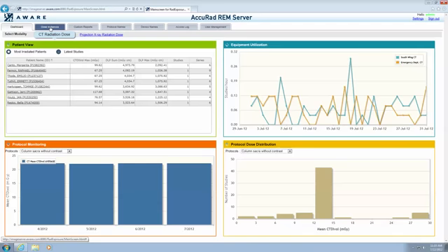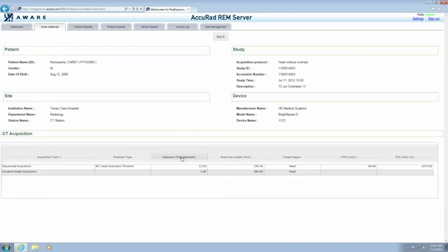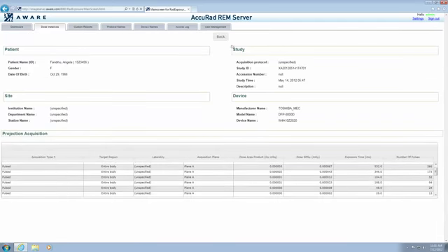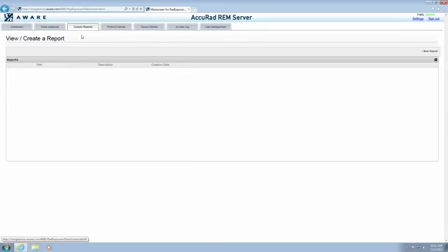On the collected data screen, we see the actual dose instances that have been collected from each machine. These can be standard radiation dose structured reports, proprietary DICOM objects, or screen scrapes of standard dose screens. This server allows data to be received every time X-ray tubes are turned on. In addition to CT, the server also supports IR and fluoroscopy. In short, the data is received, pulled apart, and pushed into our analysis engine. Here's a quick view of what that can do.